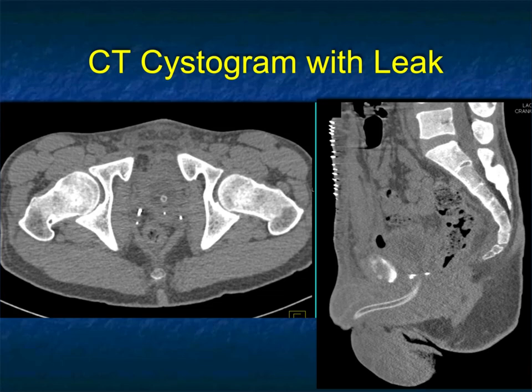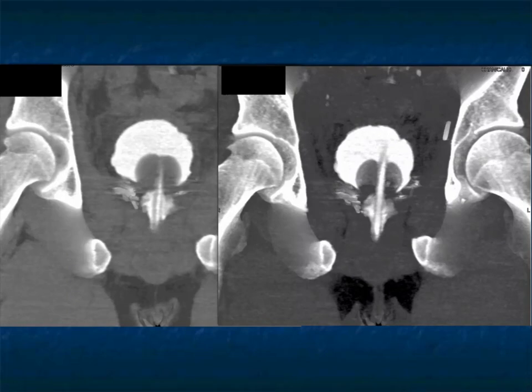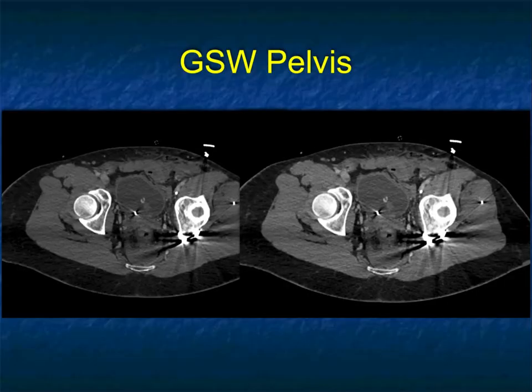Another case, here's a patient who had surgery, and they worried about a fistula from the bladder or a leak. Well, you look at these images, you can't really say much. You see a Foley in place, there's clips, but you're not saying much. Then you give contrast, and you could see as contrast drips in, there's a leak. This was a patient post-prostatectomy. Here's a leak along the urethra, a very classic location by base of bladder, but very easy to recognize when you do the study correctly with CT cystography and contrast placed within the bladder.